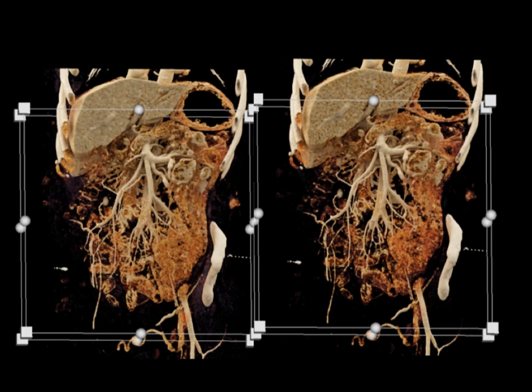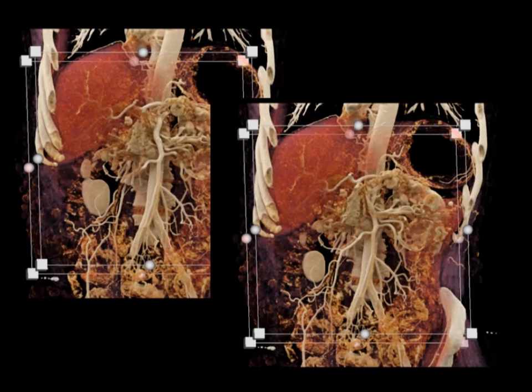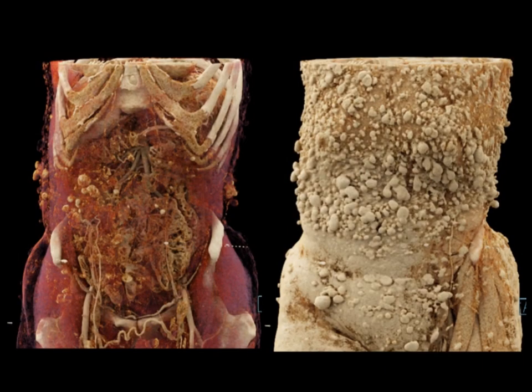And again, here's just another example of replaced right hepatic. But again, look at those vascular lesions. The harder you look, you can see multiple vascular lesions. That's one of the hallmarks of some of these carcinoid tumors, but usually the syndromic ones. And if you don't believe me, the patient has neurofibromatosis, look at the 3D rendering of the skin. Look at all of those nodules. Just a very, very impressive example.